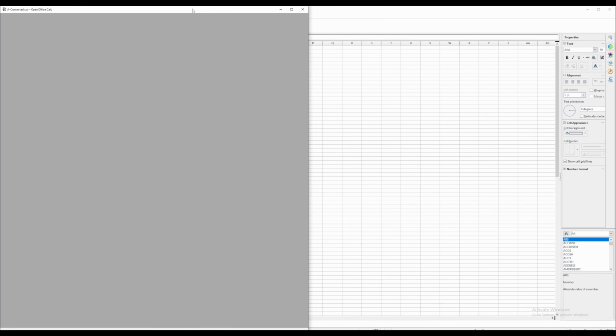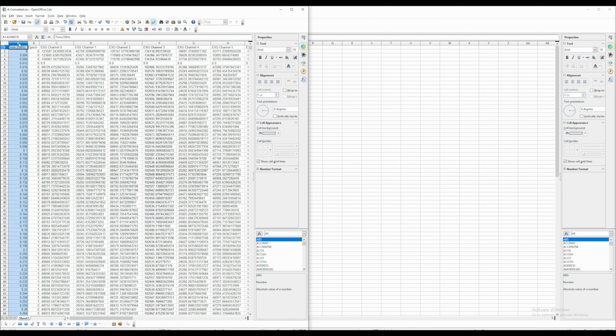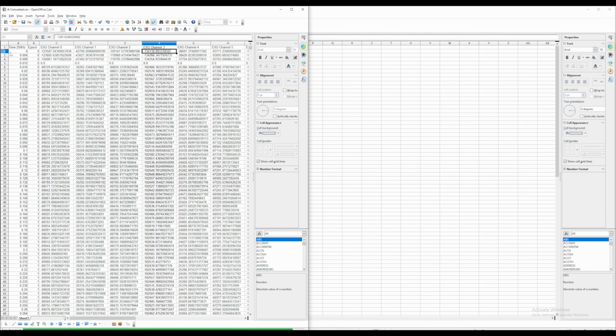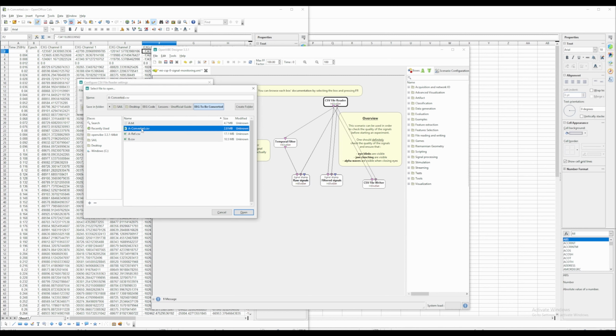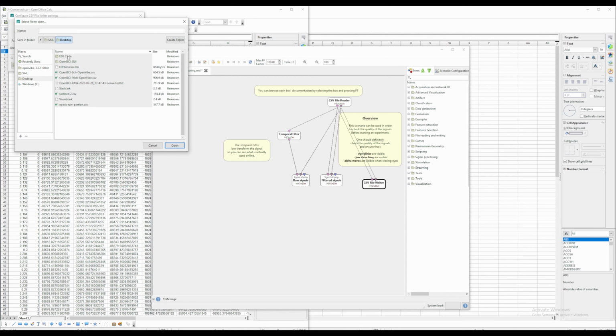And there you have it. Now I can just delete this column. And now this should be a file that's readable by OpenVibe. So let's save it and try it out. So this is our file, A converted. And this is the file reader box that we used. And I'm going to disable the file writer, although it's interesting to see how it will output next to our file.